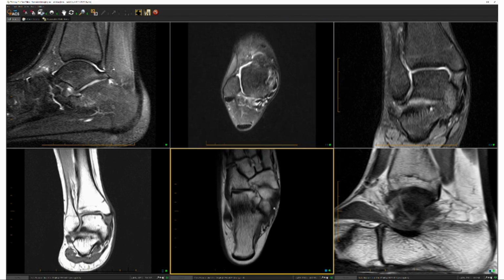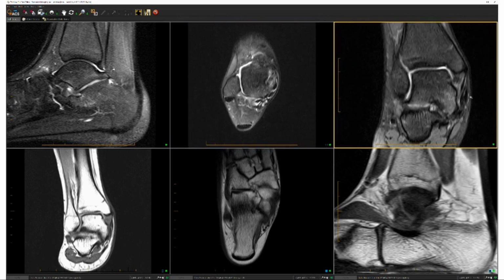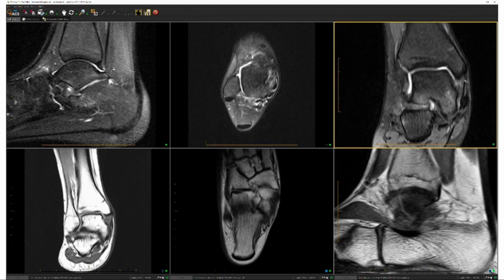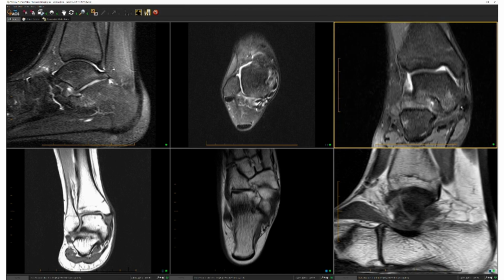And now let's get into the region of the superomedial spring ligament, which I'm having a hard time seeing one entire band here. So I'll take a look on my coronal images now to see where is that spring ligament band. And in fact, if this is my tibiospring, this is the region of my spring ligament band, and it's also not well defined on my coronal images.